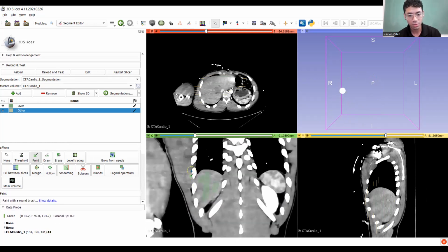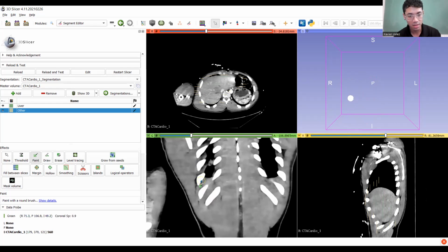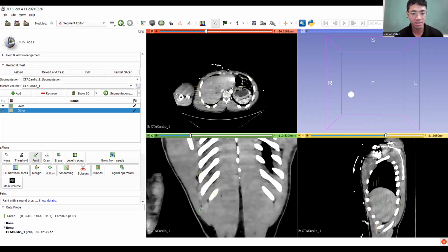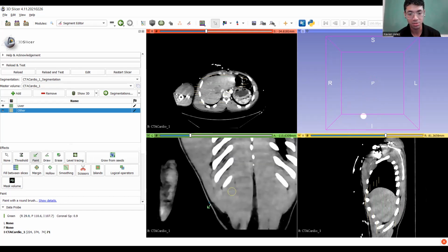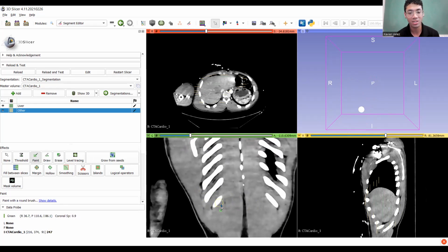And let's wrap it up over here. And I'm just gonna go. So once I see that there's, I guess, ribs, maybe, probably, crossing this, I know I don't want to take anything past this point, so I'm just gonna shade over the whole thing in other over here.